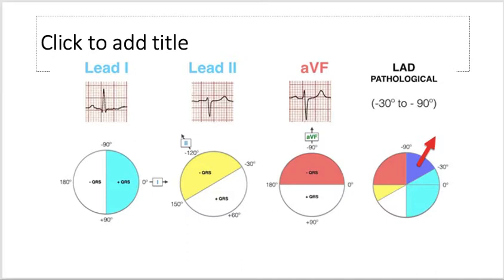Remembering the direction we saw in lead 1, let us now consider lead 2. It's positive in the plus 60 degrees direction and negative in the minus 120 degrees direction. For our example on the ECG, the R wave is negative. It's going down there. So that means the electrical activity is traveling towards the negative half, up towards the yellow half of the circle, up towards negative 120 here. Lead 2, negative R value there, going to be towards the negative side of it. So for our example, we have the negative, as we said.